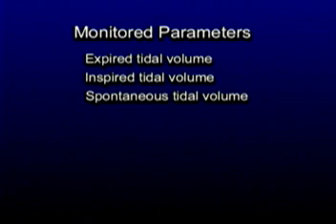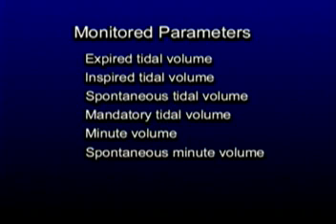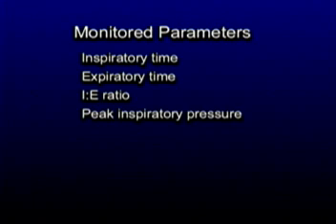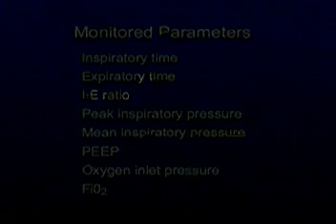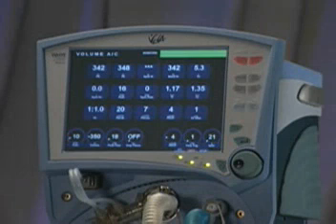spontaneous tidal volume, mandatory tidal volume, minute volume, spontaneous minute volume, breath rate, spontaneous breath rate, inspiratory time, expiratory time, IE ratio, peak inspiratory pressure, mean inspiratory pressure, PEEP, regulated oxygen inlet pressure, and FiO2. An extended display of 15 parameters can be configured from the same menu of 16 choices on the monitor screen.